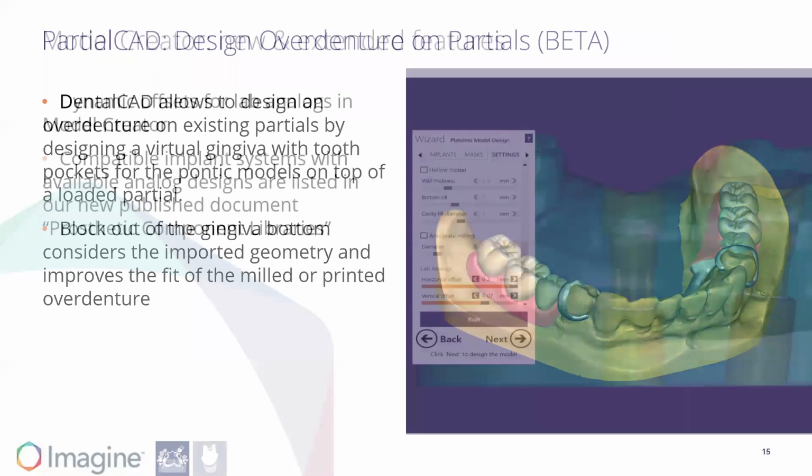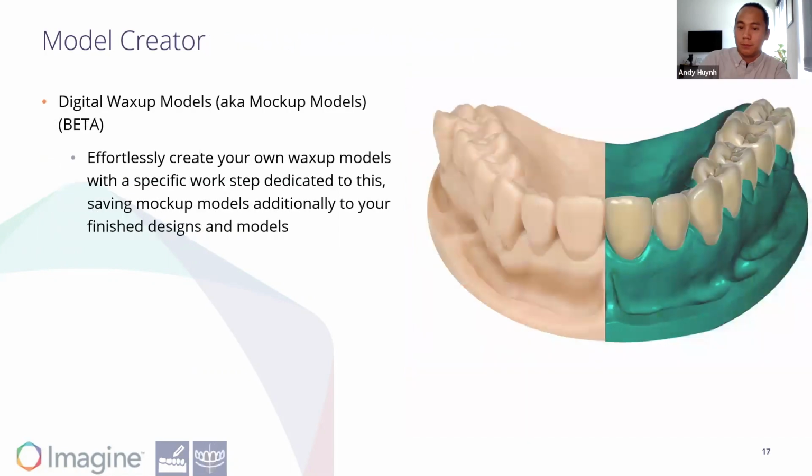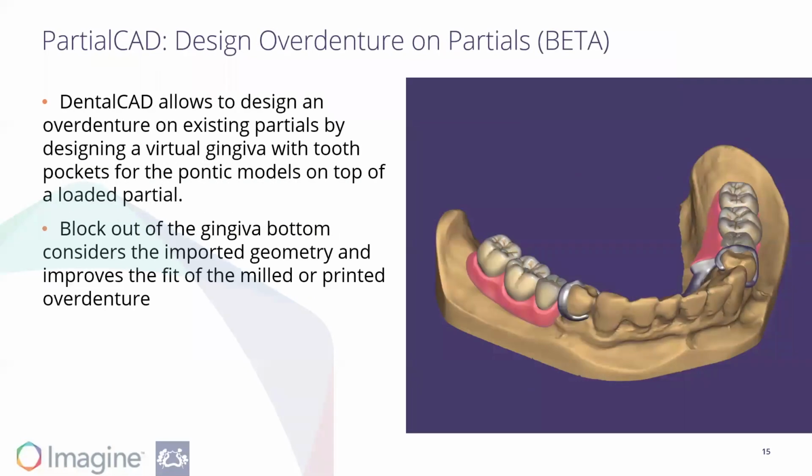Hey, Andy, real quick question here, again from our friend Nikolai. When you set up projects, are there hotkeys, or can they be set up so that you don't have to move the mouse around so much? He's talking about using hotkeys or shortcut keys to reduce your mouse clicks and make things more efficient. When setting a case up in the DB? I think setting up in the DB or just within the design, yeah.